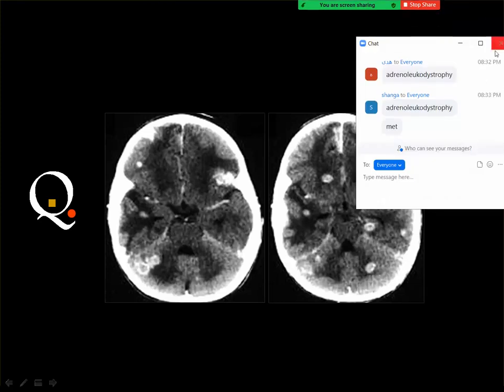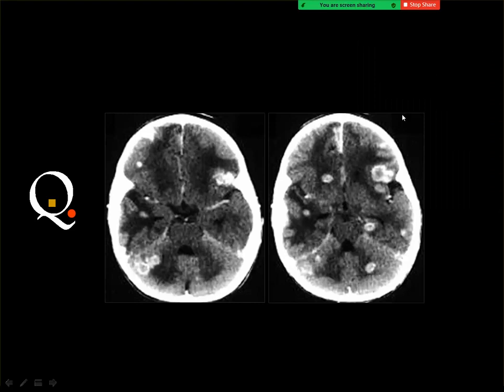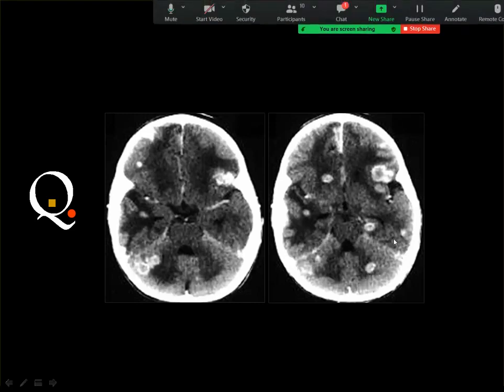No, these are not metastases. These lesions are classic for tuberculomas. You see the buttonhole or the ring enhancement, which is very thick, and internal relatively hyperdense contents due to the presence of caseous material.